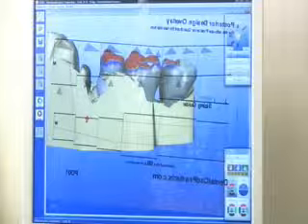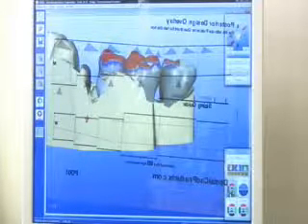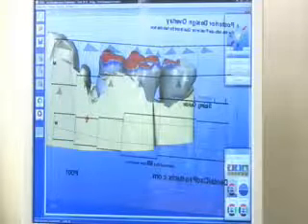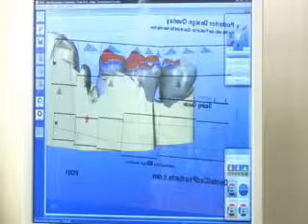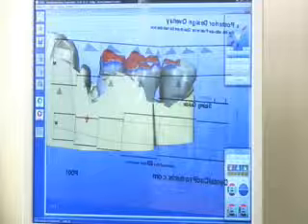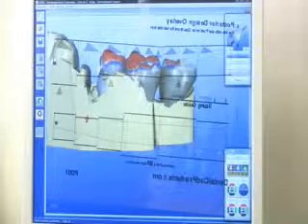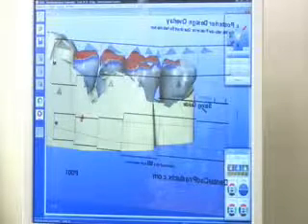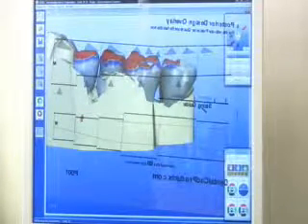I'm not too concerned with the occlusion at this time. You can see the red on the occlusal surfaces. We can modify that. I'm more worried about the proportions during this stage. As each proposal is laid down, we're able to adjust it by position and rotate, but we cannot go back to the prior proposals until all the proposals have been laid down.